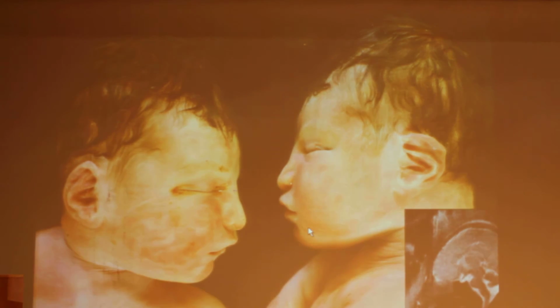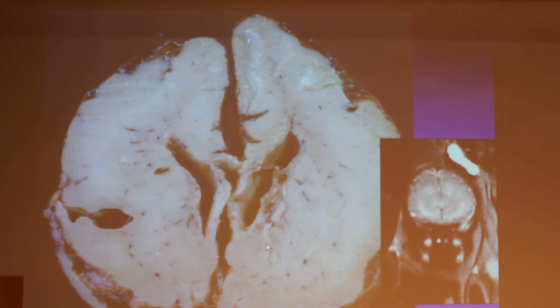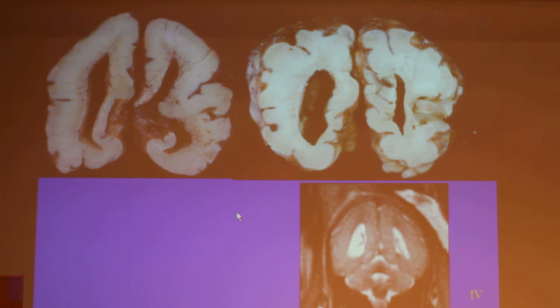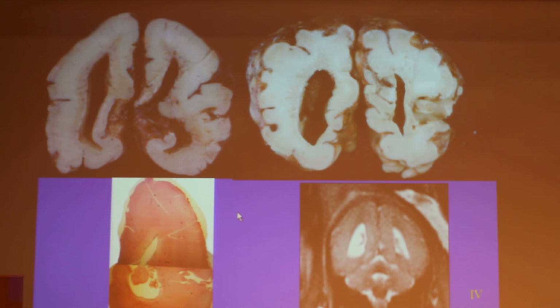And indeed, after a lot of thinking and multidisciplinary consultations, we counseled them on actually performing a termination of pregnancy. This is the pathology of this fetus, and you can see how abnormal the cortex is, and indeed it was an abnormal cortical malformation of microcephaly.